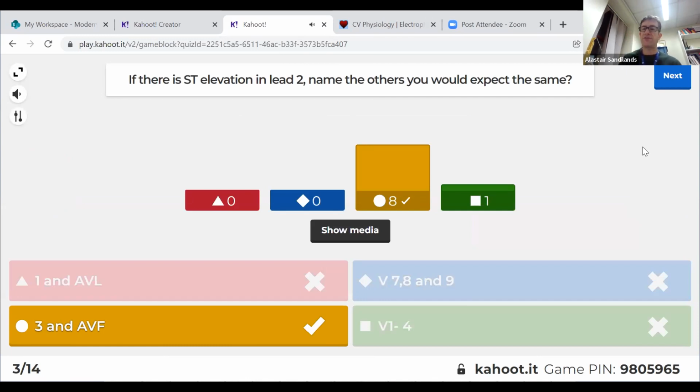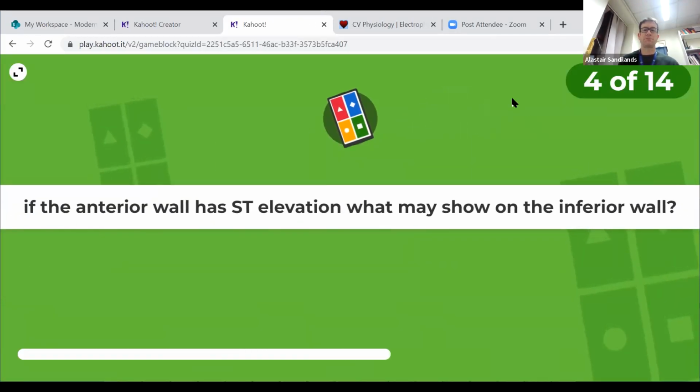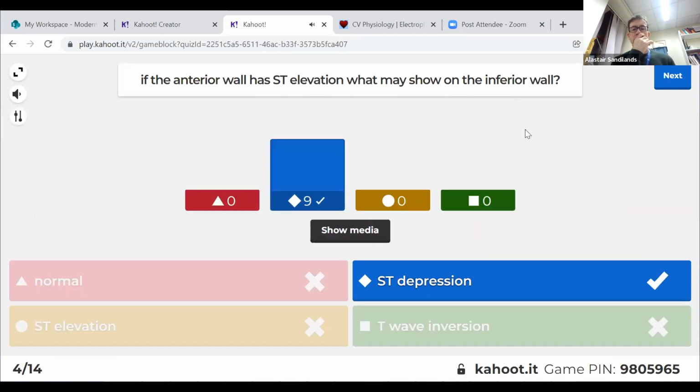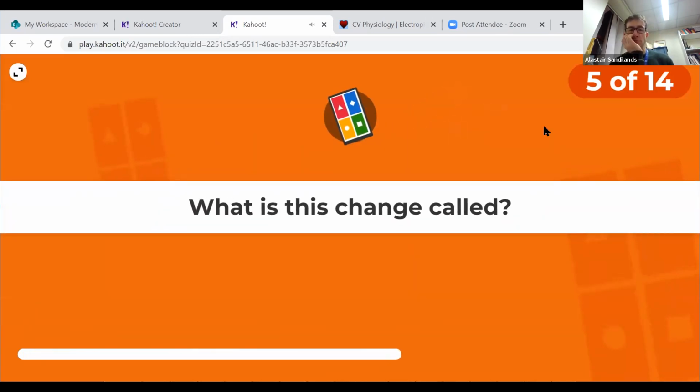Yeah, 3 in AVF. Well done. ST depression, well done. And then the last concept question.